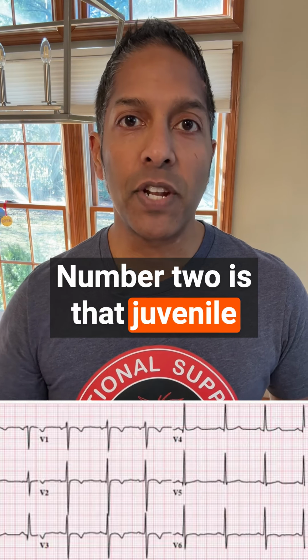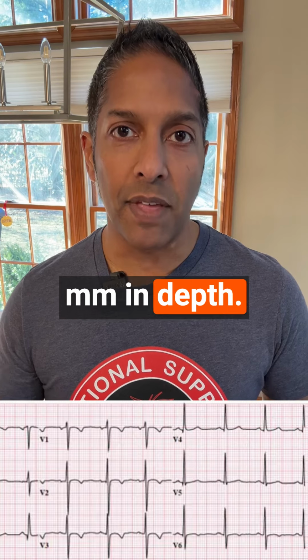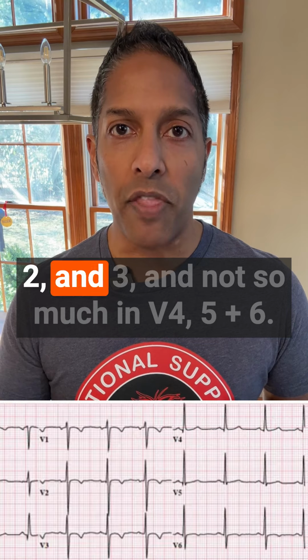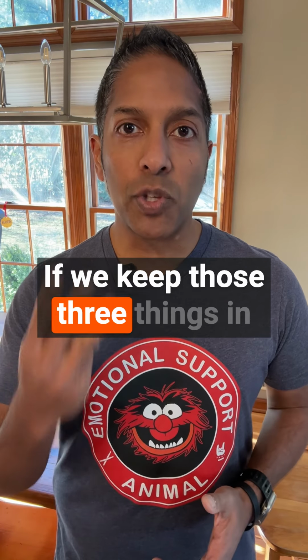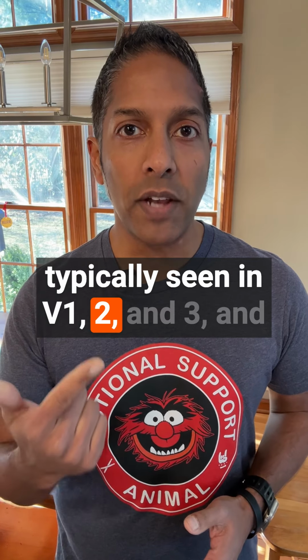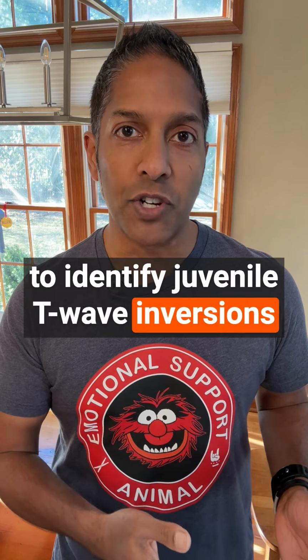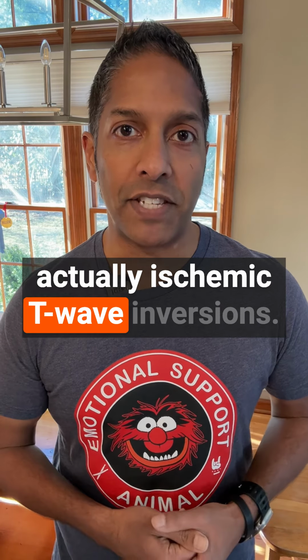Number two is that juvenile T-wave inversions are usually 3 millimeters or less in depth. And then finally, number three is that persistent juvenile T-waves are typically going to be present in V1, 2, and 3, and not so much in V4, 5, and 6. If we keep those three things in mind, asymmetric T-wave inversions, typically seen in V1, 2, and 3, and less than 3 millimeters in depth, we're more likely to identify juvenile T-wave inversions when they're there, as opposed to mistaking them when they're actually ischemic T-wave inversions.